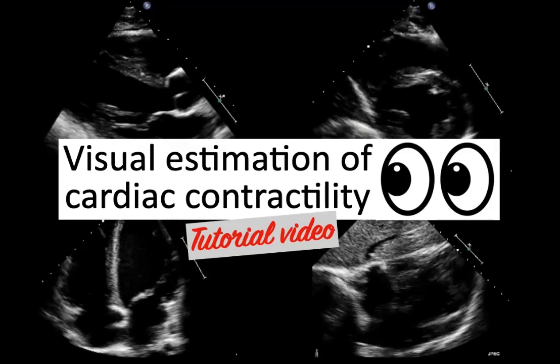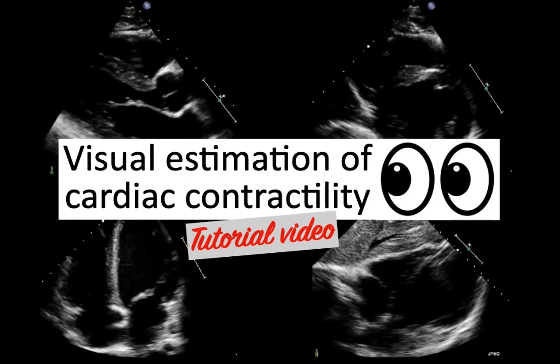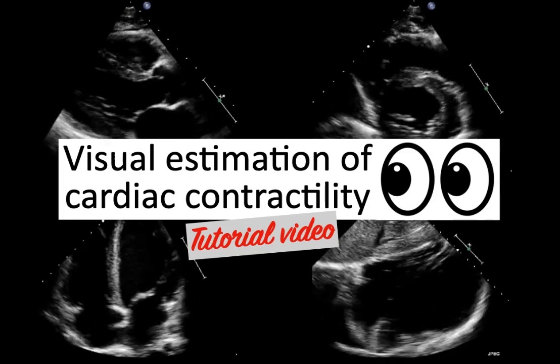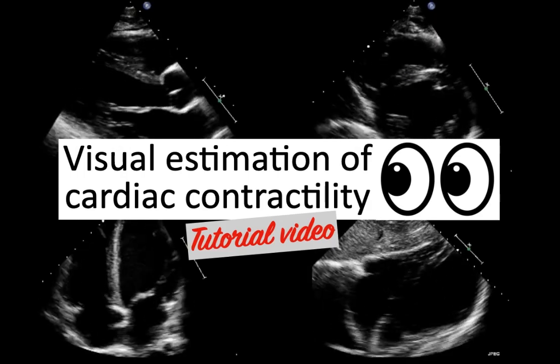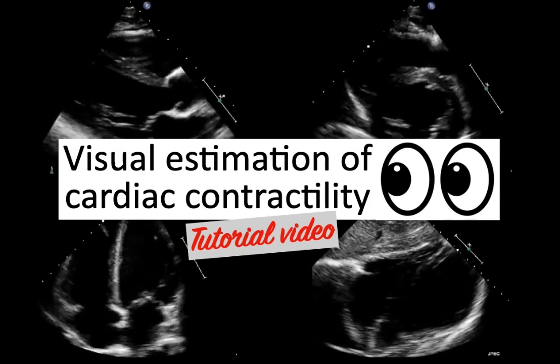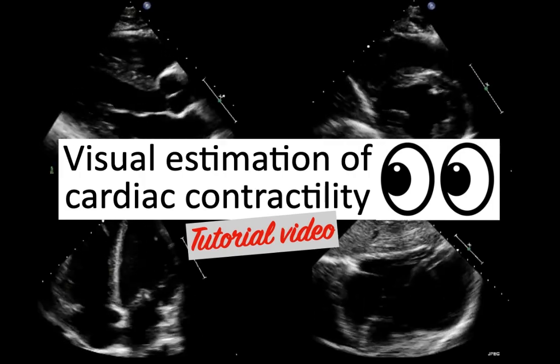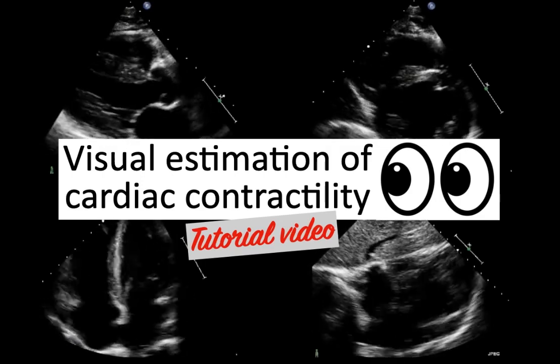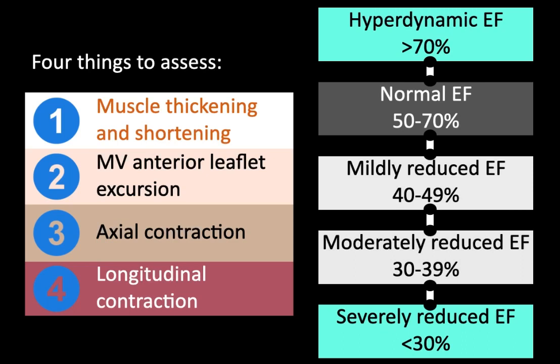Hello everyone. So we perform echo frequently on our ED patients to assess cardiac contractility, which we can do either by measurements or by visual estimation. Most of the time we do it by visual estimation as it's a very rapid method. Therefore, we need to train ourselves in this skill so that the interpretation that we make is accurate and reliable. So here I'm putting together the techniques or approaches for assessing cardiac contractility by visual estimation.